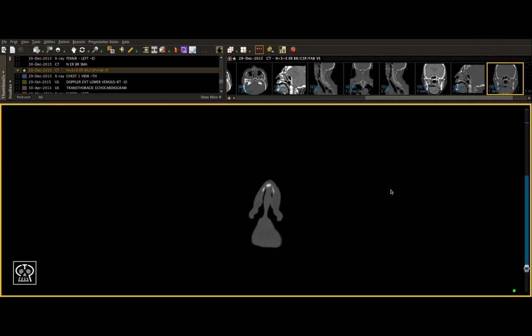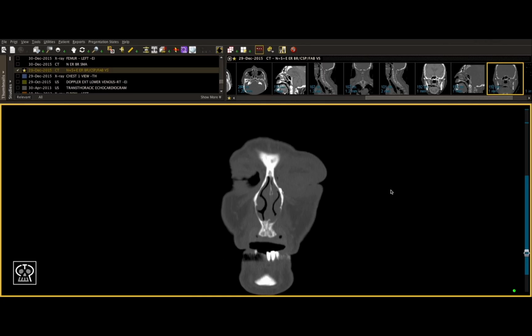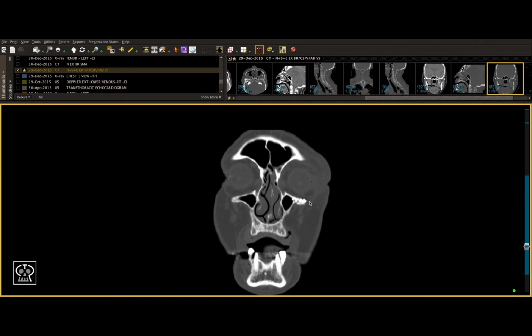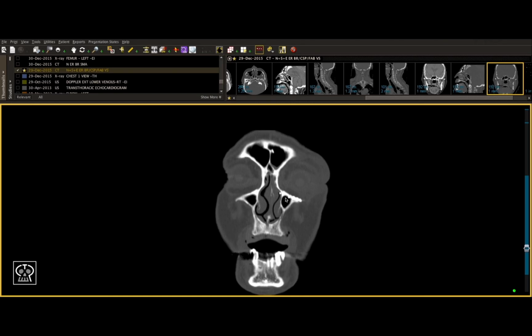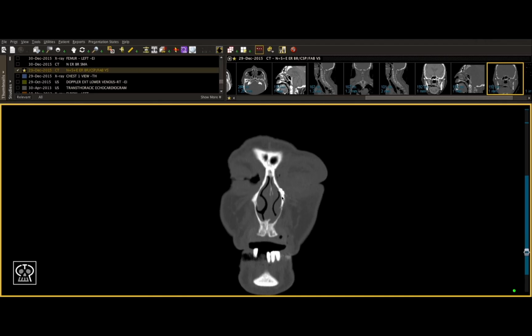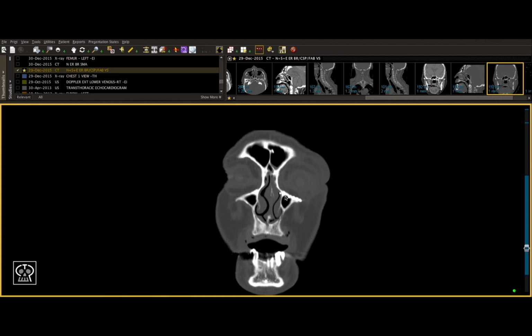Let's look at one more example. In this scan, I want you to focus on the left side. As you start to see the rims come into focus, you can see this very radiopaque structure on the bottom. We haven't really addressed this in the course thus far, but when looking at scans, it's always important to look for previous surgeries and previous fractures that may have occurred.